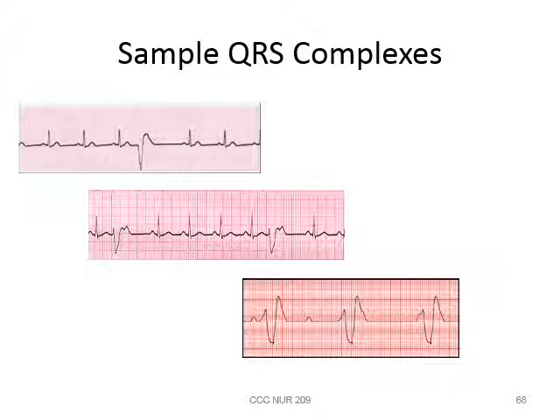Now, we talked about looking at the QRS complexes and asking, is there consistency? You look at this QRS complex, it looks totally different from the other ones. Notice that it actually is early. If you were marching this out with your paper, you would see that one goes there, that one there, and one should actually fall here, and then it's going to be irregular to this one. That's called a compensatory pause. So don't worry about a lot of that. We see here the same wide, bizarre-looking complex, and we'll talk about these. These are PVCs, and these are just another type of QRS complex.